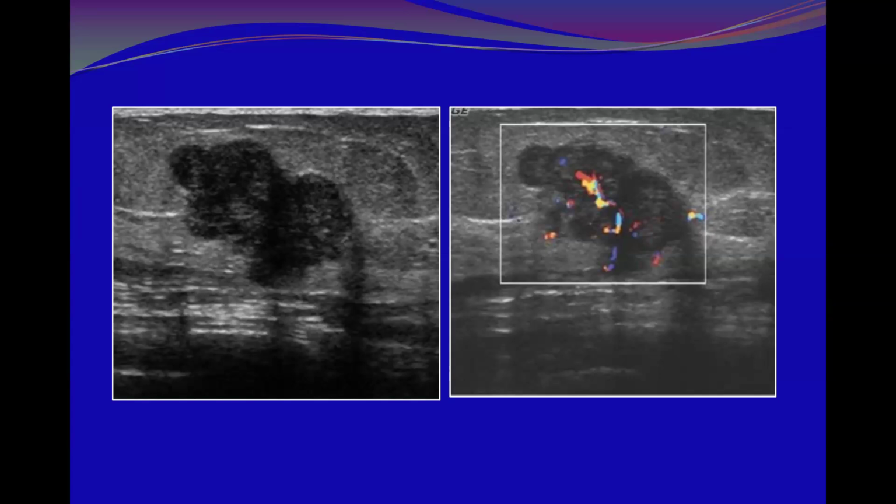Not only that, there are some large and some small undulations, not all the same. This is one issue. The other issue, there are other suspicious features supporting that we consider these lesions as an irregular shape rather than just roughly oval. Why? It is non-parallel orientation.